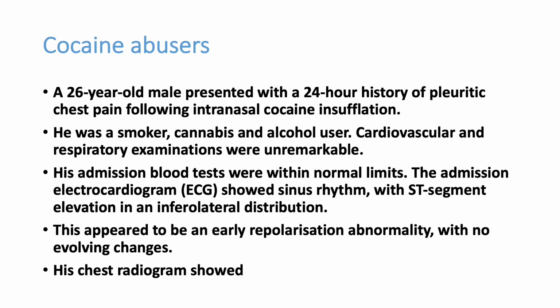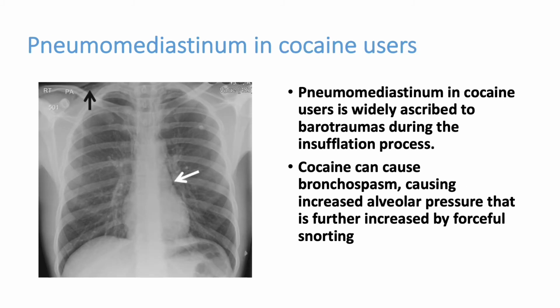ECG shows sinus rhythm, ST elevation in inferolateral distribution. So ST elevations can be there in this type of patient. He is having severe retrosternal pain. One chest X-ray was taken. We'll see what happened to the chest X-ray.